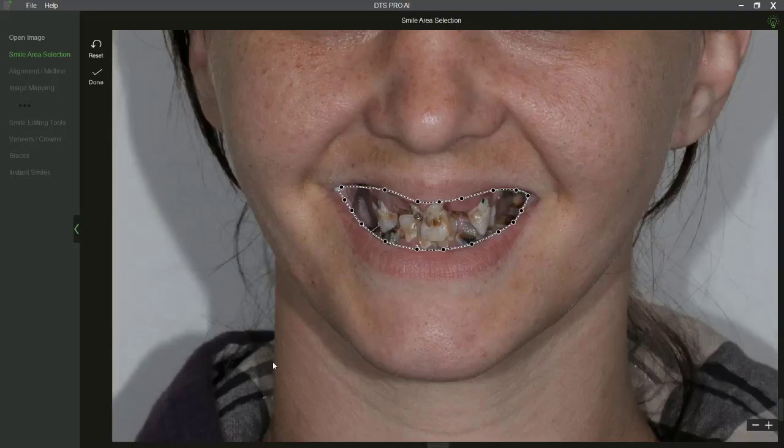You just got to make sure that your simulation is within the realm of possibility. You know, for example here, let's say if she still had all her teeth, that midline was off by 4 millimeters. So if I give a simulation where it's got this picture perfect midline, I can't accomplish that in reality unless we maybe do a long time of ortho. So it needs to be something that's possible. Now, in the case of dentures or an implant full mouth rehab, you've got a blank slate, so anything's possible. You can throw whatever in there.